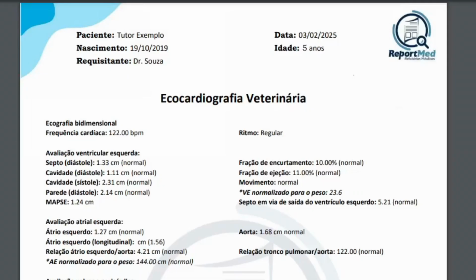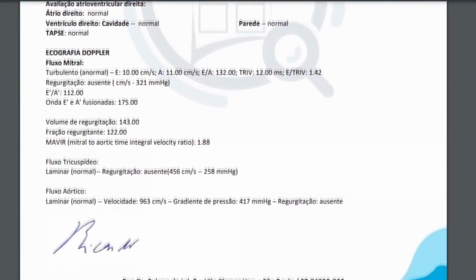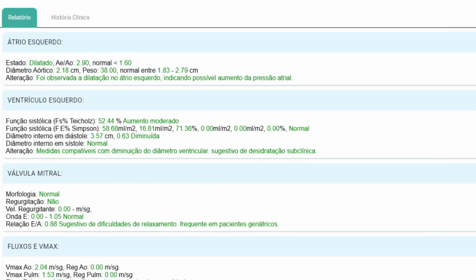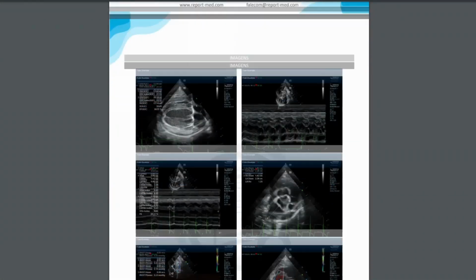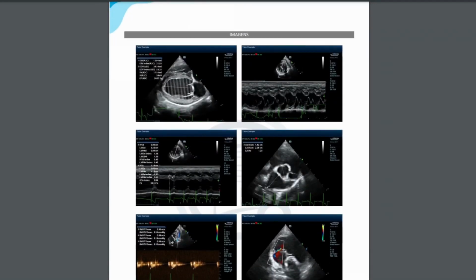The suggested report layout is 100% customizable, allowing the doctor to modify it as needed. Not only the layout of this report, but also the PDF-generated report. Everything is 100% customizable, allowing you to completely alter the structure. Here is an example.